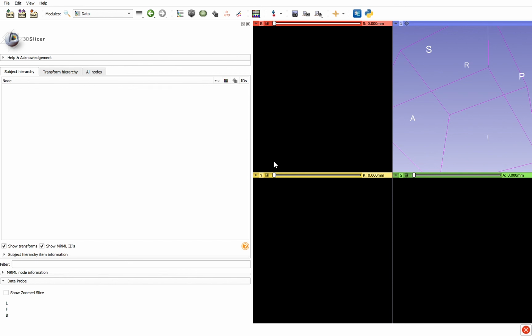you're going to open up one of your segmentations. So in this case, we'll just do 402, and then we'll look at segmentation 402. We're going to open this up, and the first thing to make sure to do is, the MRI is going to open as a volume. Great. And we want to open the segmentation as a segmentation.